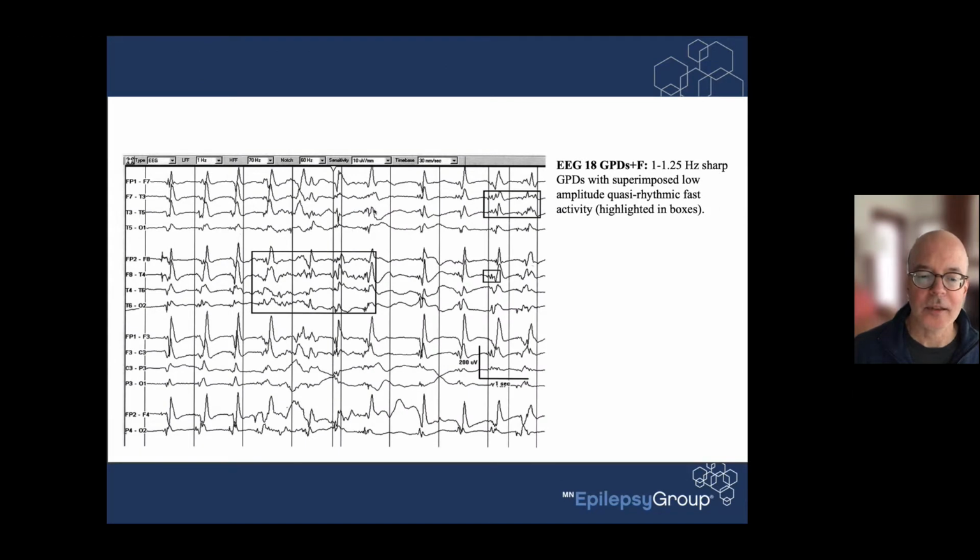more in that plus modifier. So you have the plus modifier. See how they have these spikes? You have the sharp waves, and then you'll see these little spikes. That makes you much more along the lines of, this is on the ictal interictal continuum. And see how they have those.